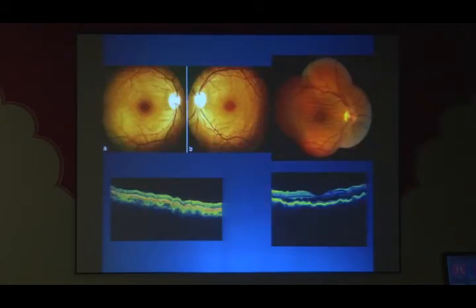These are cases which probably are dystrophic in nature, bilateral, symmetrical. These are striae which are circumferential, and these are striae that are almost horizontally, parallelly arranged. And these are probably cases of, we haven't made a diagnosis or haven't fitted them into any particular entity, but probably of dystrophic nature without any obvious pathology.